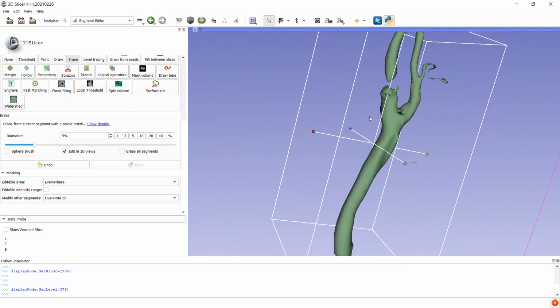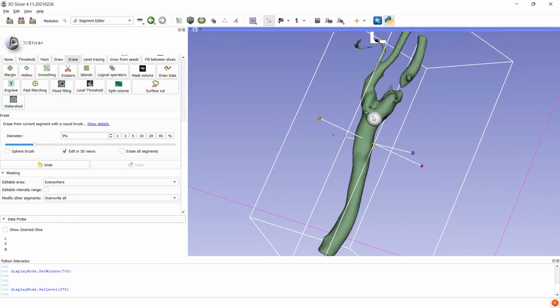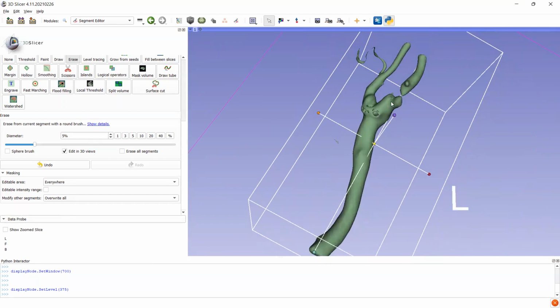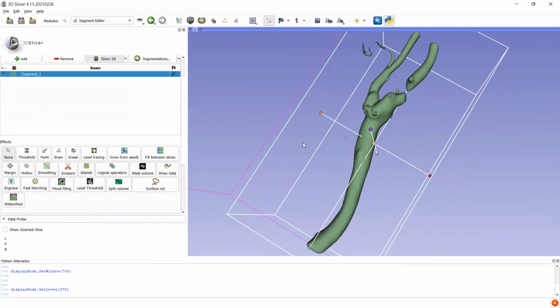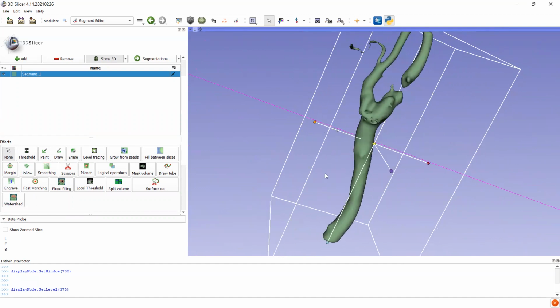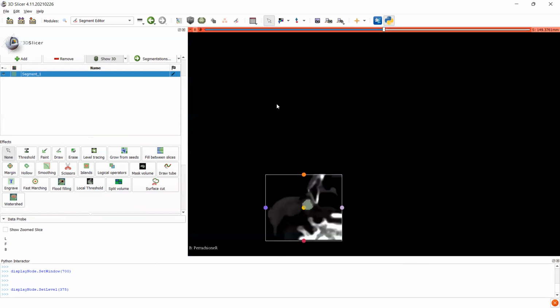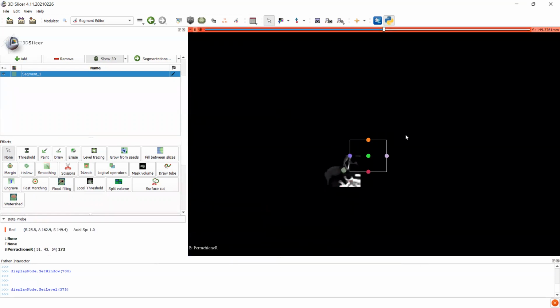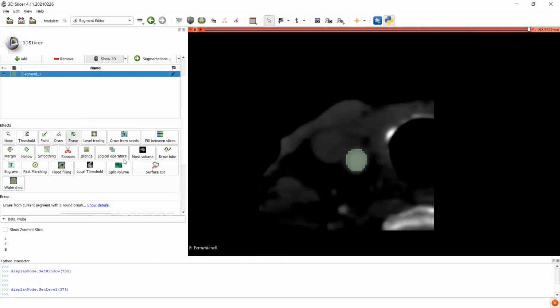And that's about all we can do in 3D mode. You see the geometry is still extremely poor around this bulbous region, this hole-like thing. This is pretty characteristic of Slicer's algorithm, but we're going to be removing all this and cleaning this up and connecting these manually. So I suggest removing that away. And we're going to start at the bottom.